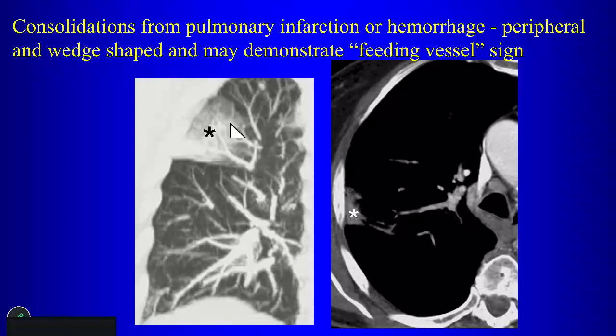When you're looking at these CTs and you're trying to decide if it's an infarct versus consolidation versus atelectasis, what are the things that you would look at to try to make that differentiation? You see a peripheral opacity. Is it an infarct? Is it atelectasis? Is it consolidation? What do you do to decide that's an infarct? Look for volume loss to exclude atelectasis. Well, you can have atelectasis without much volume loss on CT. I mean, we always kind of see that. If you have lobar collapse, right, yeah, then you're going to have marked volume loss.